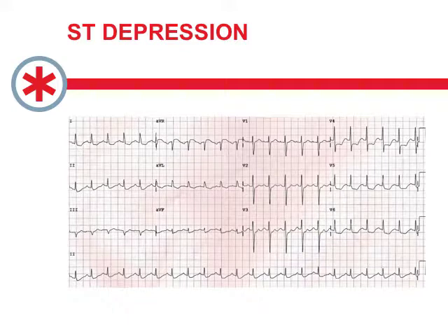So let's say this is a 56-year-old patient with chest pain, and take a moment, maybe pause the video and have a look at this ECG. Actually, I guess the answer to the thing is right on the top of the slide. So your eyes are going to get drawn particularly to the lateral leads in V4, V5, V6, and maybe a little bit in 1 in AVL, where you see ST depression.